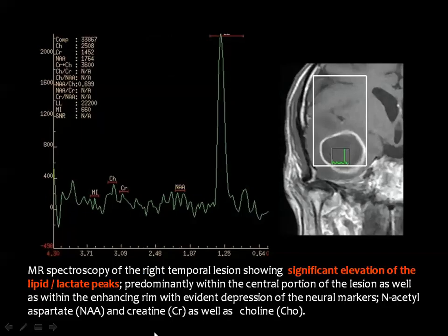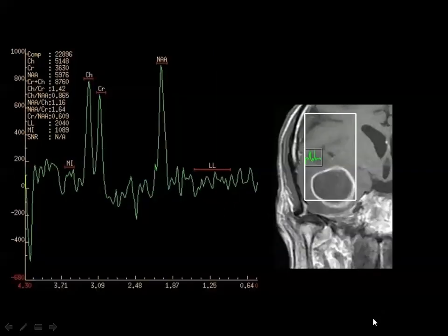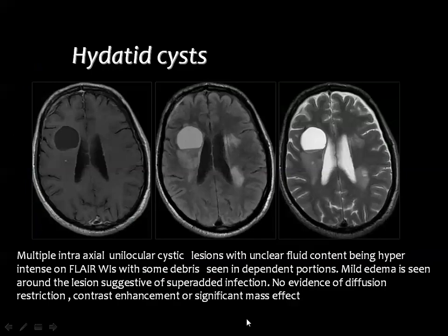And this is also a spectrum obtained from the central part of a brain abscess in the temporal lobe. You see a very high peak of lipid and lactate, and depression of all metabolites: the NAA, the creatine, and choline are depressed. There is no tissue here, there is only pus. But if you have a spectrum from nearby the abscess, you get a normal brain MR spectrum, with the normal peaks of NAA, creatine and choline.